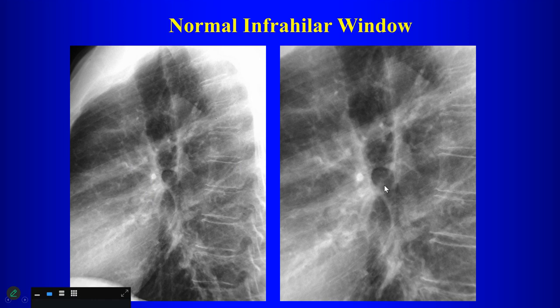Beyond. What is that? Bronchus. Which bronchus is that? Right. The right bronchus is higher. Oh. That's the left main bronchus, sometimes the left upper lobe bronchus. All right. This is the infrahilar window in here.